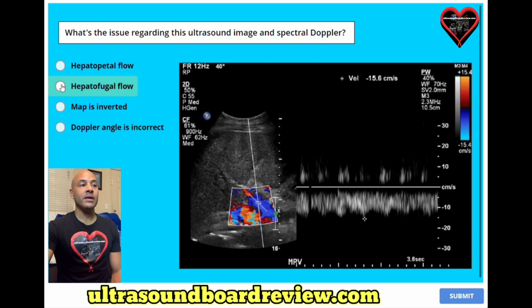The answer is B, hepatofugal flow or flow away from the liver, and this image represents Budd-Chiari syndrome.